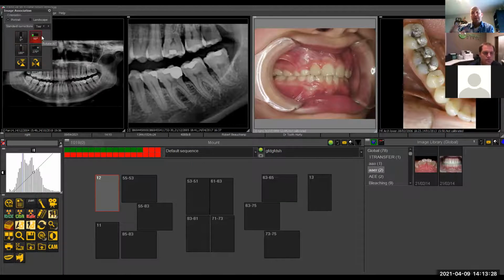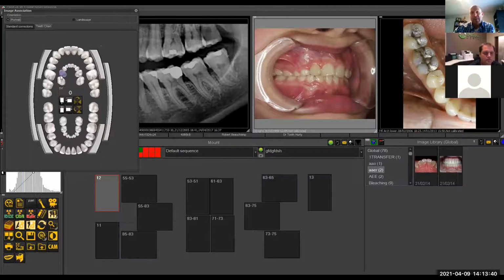And if you wanted it by tooth number and landscape, so landscape allows you to change it from upright to landscape. And then if you click on the tooth here, now you can actually name it by teeth number. Beautiful. So now it'll be by tooth number. Now this is the Canadian tooth number. We have the American tooth number. So you can do it by that. And then if you save now, it'll save it by that tooth number and it'll save that sequence that way.